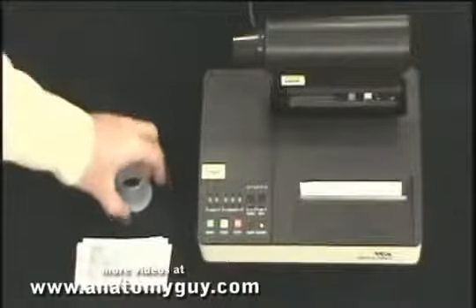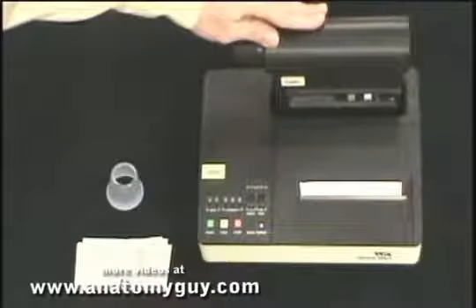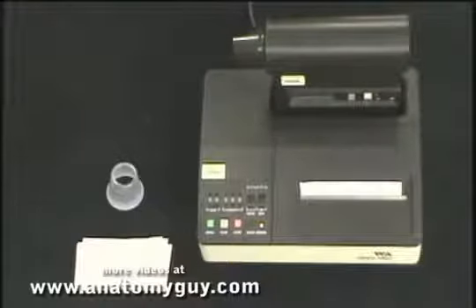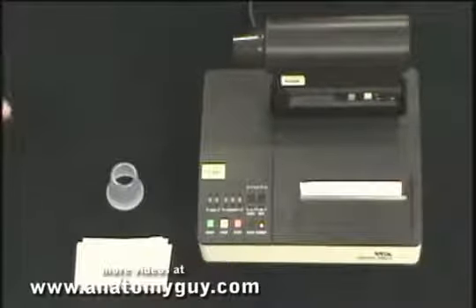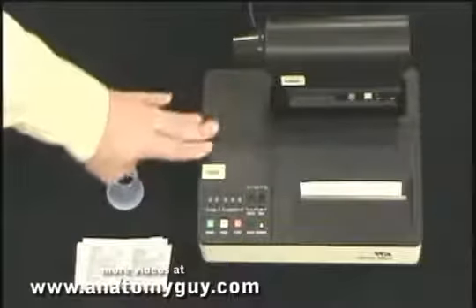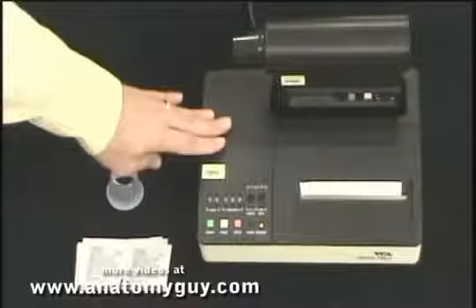This machine has important functions, got a mouthpiece, which you want to make sure your machine is clean. Any of the digital machines require calibration, usually with a large plunger that will give you a measured amount of air so that you can calibrate the machine. The most important thing is making sure that you know your machine and how it works. Many are attached to computers now, and some have extra functions. This is a very basic model.